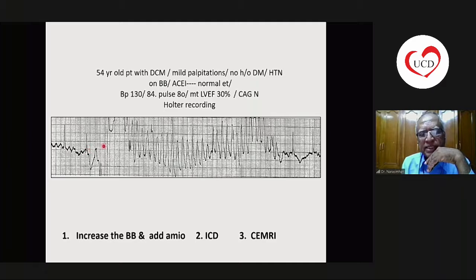So what you see is you can march these high frequency components. If you take a caliper and march every RR cycle, there is an RR that is hidden there. That is one of the simple things: when you put a Holter for recording, the commonest reason for this is muscle activity. When a person brushes the teeth or anything, it will produce this kind of frequency that is recorded. So ensure that the leads are placed on a bony point, on the rib, rather than on the muscle. That tends to minimize this, and it's fairly adherent.